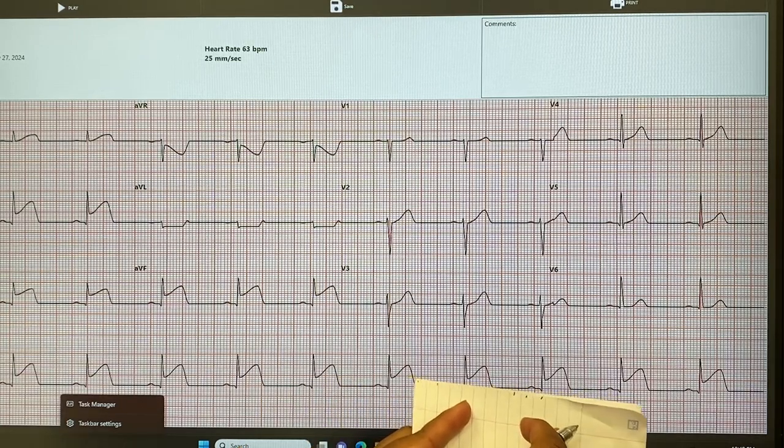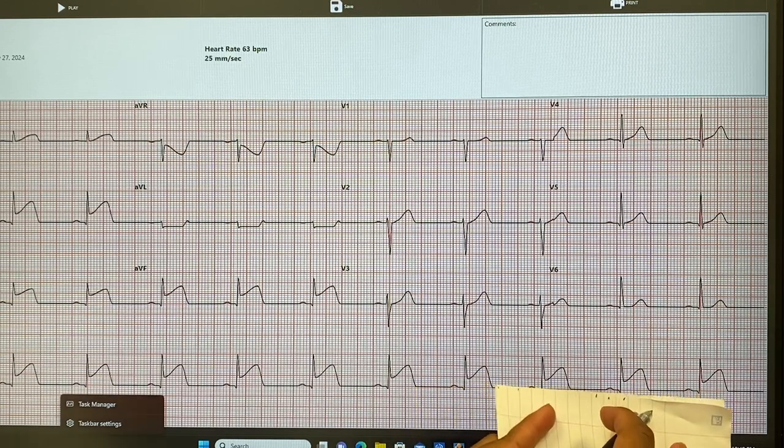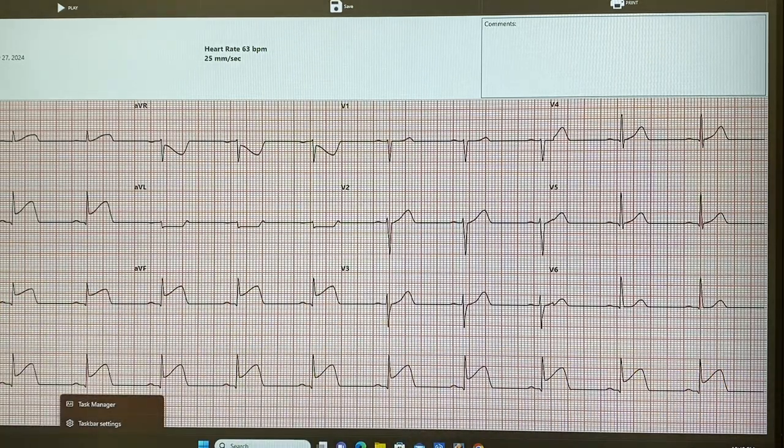Seems so to me. Normal and constant. So no problem. No blockage in the atrium, right? So no AV blocks. Right? So we're not looking at any AV blocks. Okay, next.